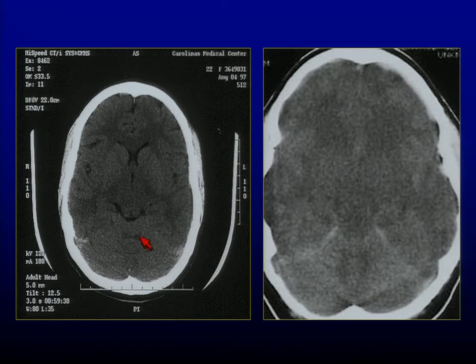There's another really tight brain, loss of quadrigeminal cistern, and loss of all the gyral space all the way around. But this is a representative cut. This is basically the same cut on 2 different patients. Quadrigeminal cistern, what I expect. Quadrigeminal cistern, what I get. This is one who I would not, for anything, put a lumbar puncture needle in their back because I would be very concerned this person would herniate.